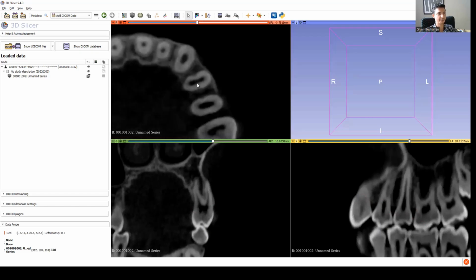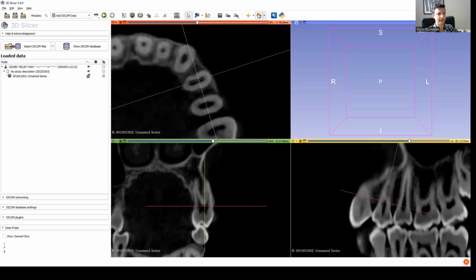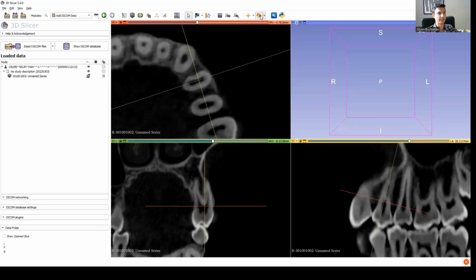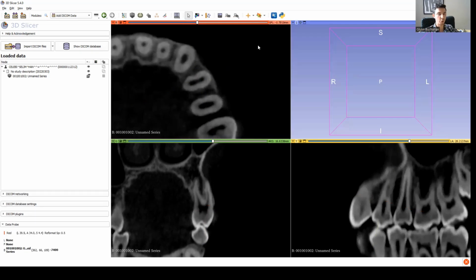So that level where they come together again, if you go back to your annotations, you can see that we're at the level of the crestal bone or the bifurcation. And that then is not part of the canal structure anymore. That is part of the pulp chamber. And we're not classifying the pulp chamber, we're classifying the roots and the canal structures. So in this particular case, the classification would be 2MP B1L1.